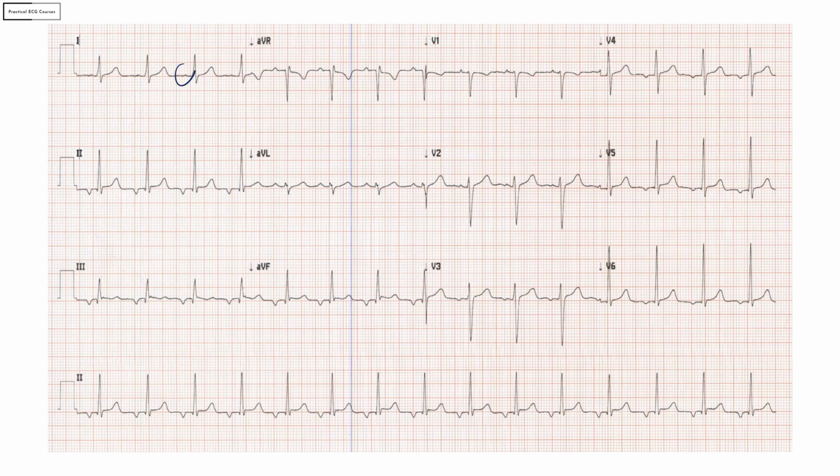To look at the rhythm, we normally look at P waves in the frontal leads. In a normal sinus rhythm, you would expect that the P wave is positive in all of the frontal leads except AVR, where it is generally negative. However, in this case, you can see that the P wave is positive in 1 and AVL, but in 2, 3, and AVF, it is inverted. And you can see that AVR also has a positive P wave. So what this tells us is that this is not a sinus rhythm. So it is a non-sinus rhythm.